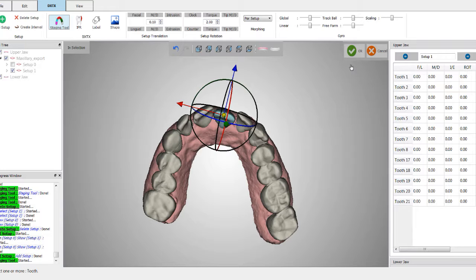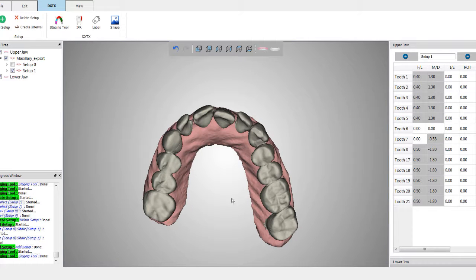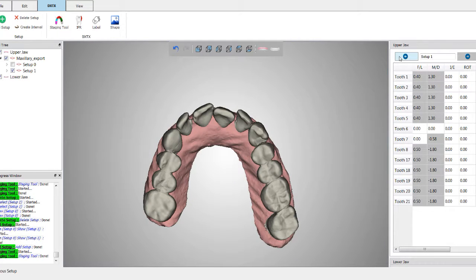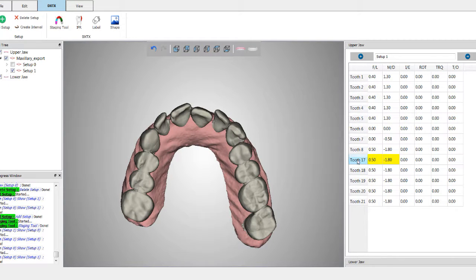But the whole idea, for the first portion of the patient's treatment, is to make room for those teeth that are blocked out. Okay? So now I'm going to click on OK. We're now calculating the distance of the tooth movement as well as morphing the gingiva. In the software, you click back to 0 and then back to 1, and that's going to highlight the teeth that have the highest displacement. If you're curious, the upper right canine here has the largest displacement.